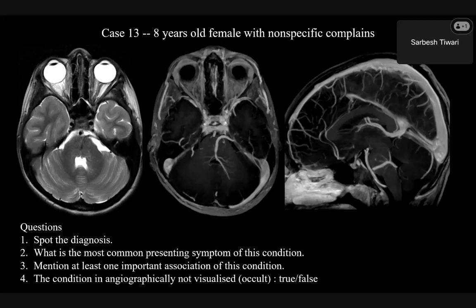So 98% are incidental, 2% will have hemorrhagic venous infarct. Most common associations are cavernomas, sinus pericranii. Because it's a developmental malformation, it can also be associated with cortical malformation. One malformation is always associated with other malformations. So remember, DVAs can also be associated with cortical malformation. You can have HHT or blue rubber bleb nevus syndrome. Angiographically, the caput medusae appearance is classical for this diagnosis.